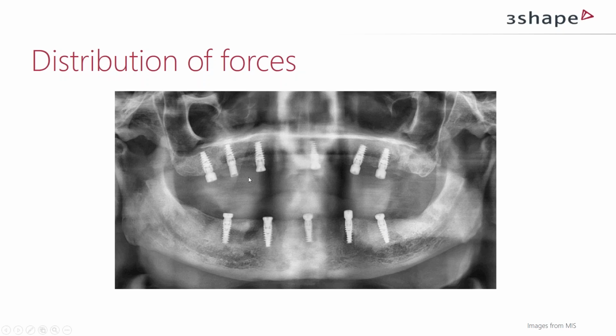In the upper, we want to go a little bit longer, so we are up to 9 here, and that is good. About 10 teeth in the upper and 10 teeth in the lower is approximately what we do most of the time. Also, we see the angles again, vertical to the bone, so they can receive the forces in a straight line.